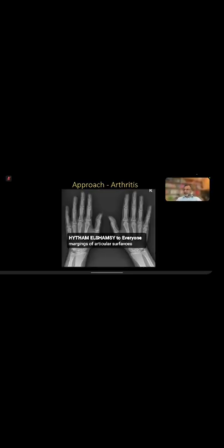Okay. But we have to have a system, just a small system of looking at these things. We'll look at that in a minute. So we look at the distribution first. So, overview. Go back, look at the X-ray. Just have an overview. Like we used to say, look at the bedside of the patient, look at the patient as a whole and see what's going on in there. So is there any abnormality? What is the distribution of that abnormality? Very good.